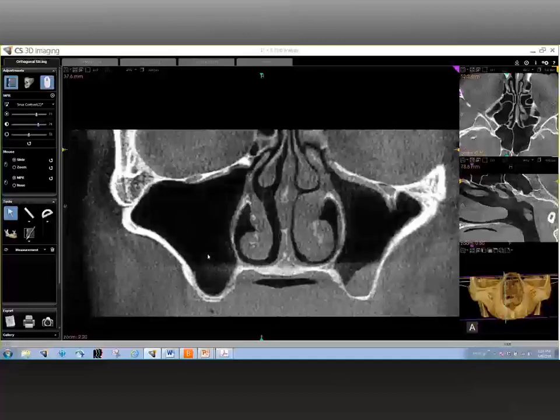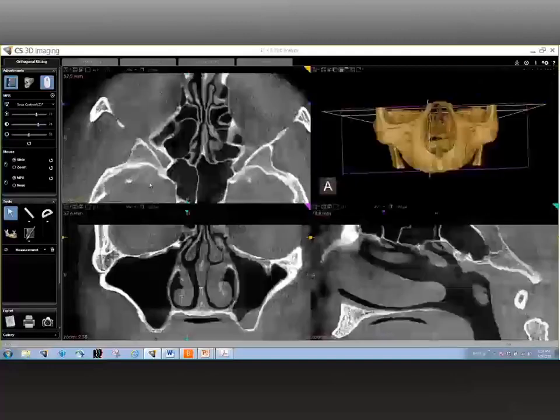Well, I think, Jordan, you're referring to what you're seeing in the sinus right now, the little bit of gray area that you see within the sinus. Yeah. That is a good question. Now, if you notice, it's actually bilateral. When we move the scan, you can see that it's not just on the left side. You can also see it on the right side.